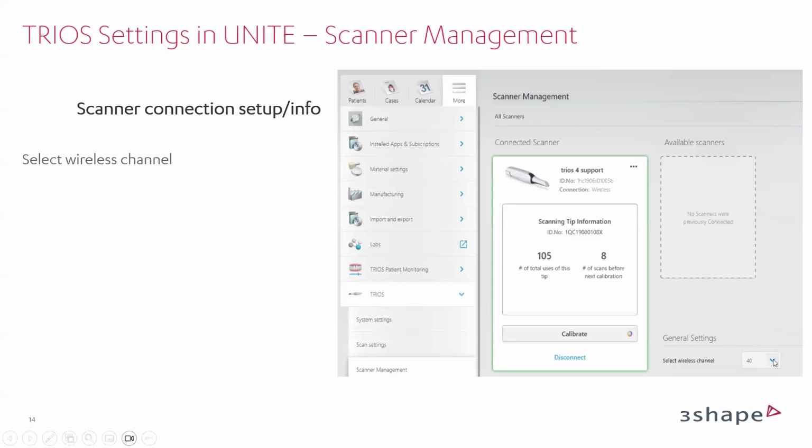Here you can see that the 40th channel is the default channel for all wireless scanners, but sometimes this wireless channel can be overloaded and you can select another one, for example the 44th or 48th. So you may select the channel here. You may also disconnect the wireless scanner by pressing this button. You may switch between scanners if you have 2 or more scanners added in the list, so you can deselect this one and select another one.